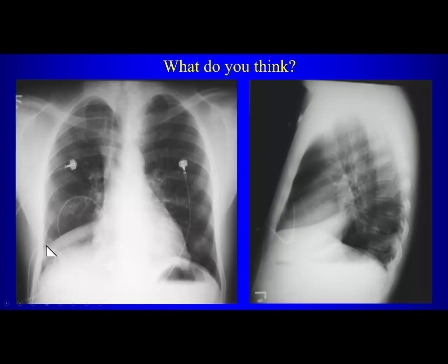It's displaced inferiorly, okay? Another sign of pathology in the right middle lobe can be obscuration of the heart border. In this case, it's really not that obscured, okay? The lateral view here, also you can see the hilum is kind of sucked down towards that. The lateral view here is very helpful because you see what? Opacification in the right. What about the shape of the opacity? It's abutting the minor fissure. This shape is a triangular shape, right?